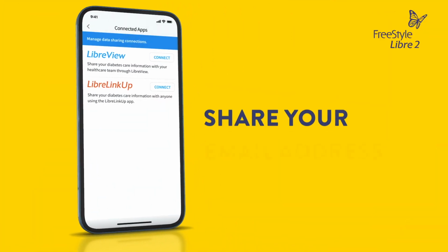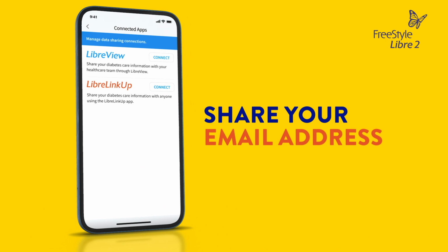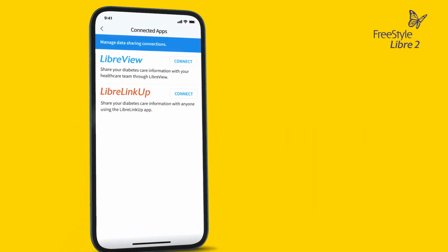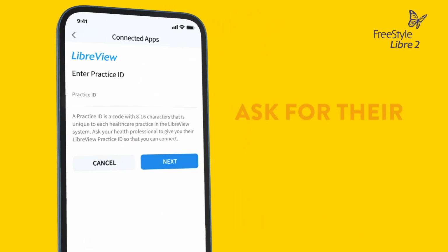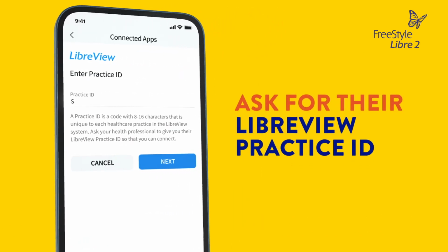One is to share the email address you used to create your LibreView account with your doctor and ask them to invite you to connect. The other is to ask them for their LibreView practice ID and enter it into the FreeStyle LibreLink app.